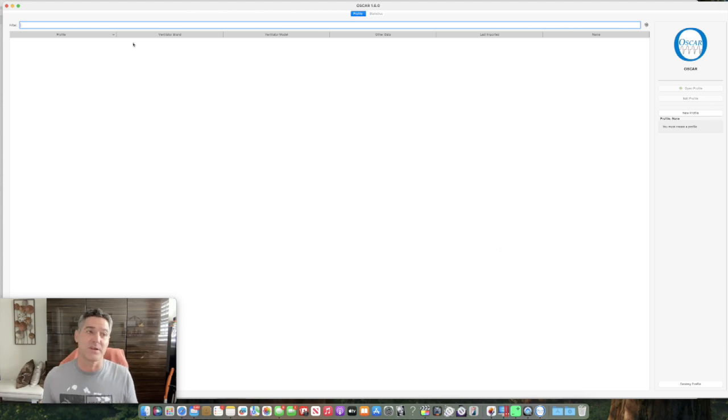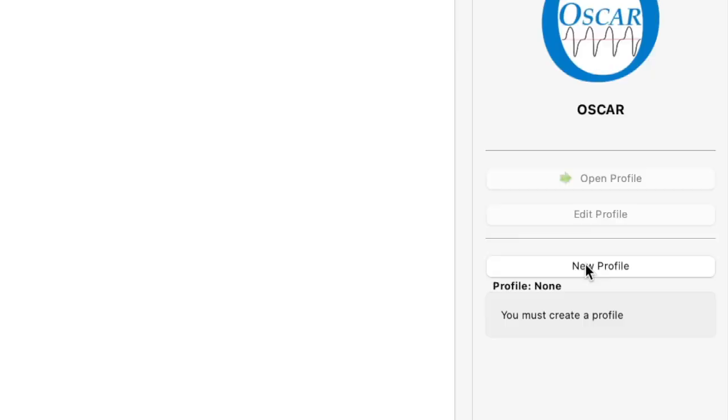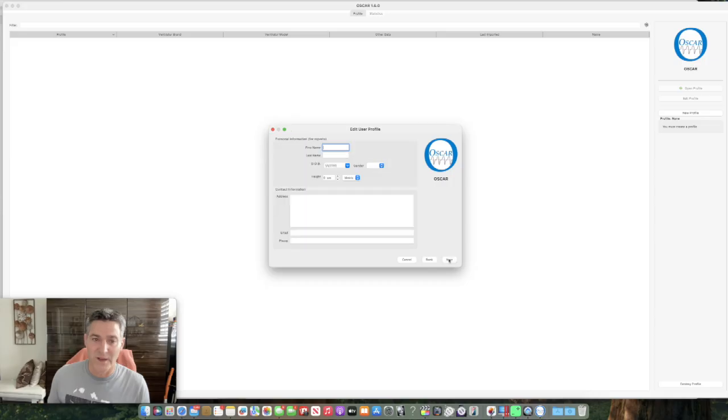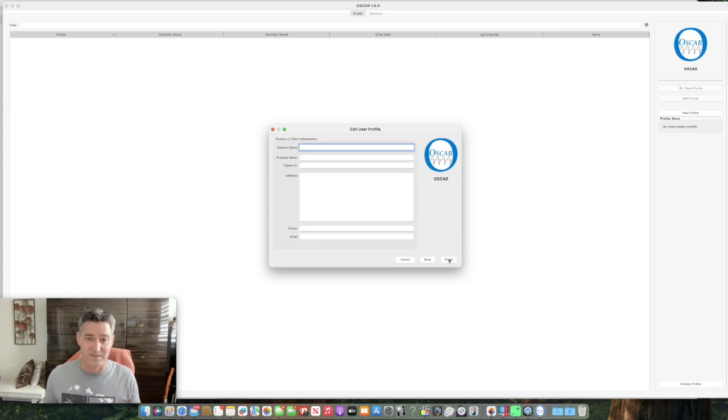So a lot of people get stuck here too. What am I doing? So you have to create a new profile. You're gonna hit the new profile button, and then username. Obviously, we're gonna select Jocelyn. Go next. This is all super unimportant. So I just go next, next, finish. Save it. Yeah, let's do that.